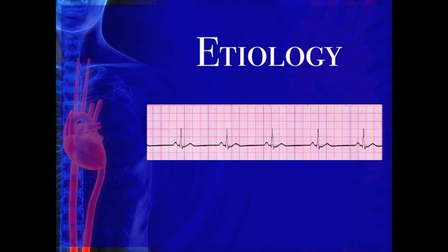Sinus bradycardia may be caused by head injury or medications, may be present in a healthy, well-conditioned person, or as seen in the video, is common in early stages of myocardial infarction and associated with angina. This causes decreased cardiac output, resulting in symptoms such as lightheadedness, dizziness, hypotension, and vertigo.